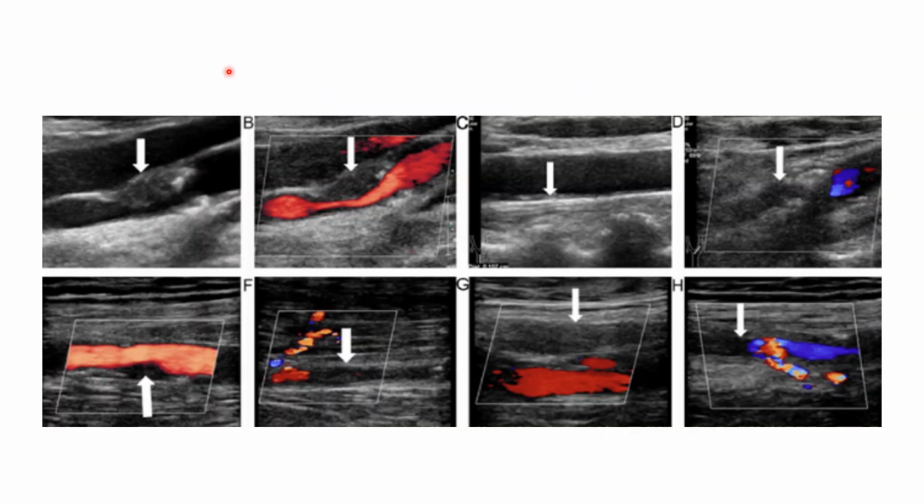So here are just some examples of the areas we're going to look at. Here you can see this is the tunica intima. This is an older image, but you can see that there's this disruption in the continuity of the tunica intima. You can see that it actually has a line of tunica intima here with a thickening behind it, probably indicating some fibrotic plaque. Here would be an earlier stage of a pathologic change where you just see a little bit of roughening of that tunica intima. And obviously, once that becomes roughened, things are more likely to stick or adhere to it. And so that's going to be the beginning development of plaques.